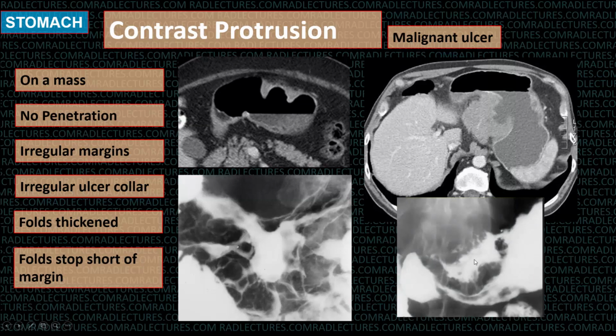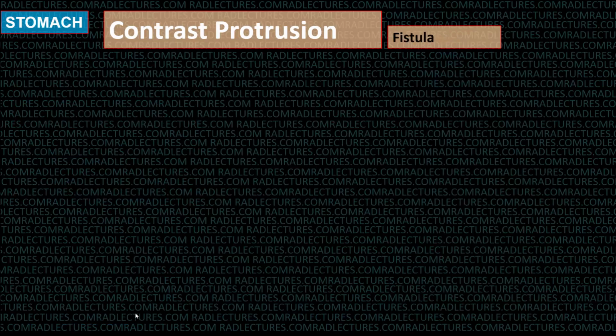And here is a very typical sign. We don't see it that often. It is called Carman's meniscus sign, which is basically, if you compress this tumor, what you will find is that the margins of this ulcer join together and produce a filling defect, and this is the barium in this part of the ulcer. So that is called Carman's meniscus. So Hampton's line is a sign of benign ulcer. Carman's meniscus is a sign of malignant ulcer.